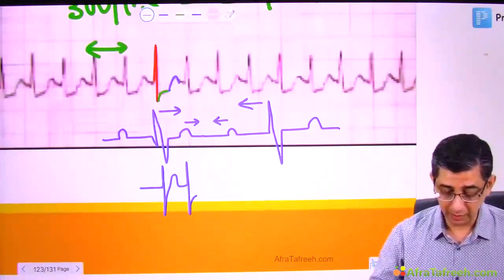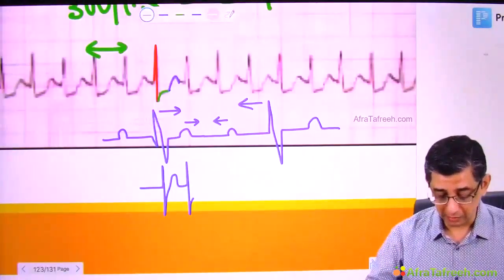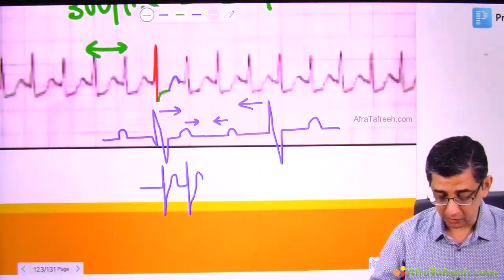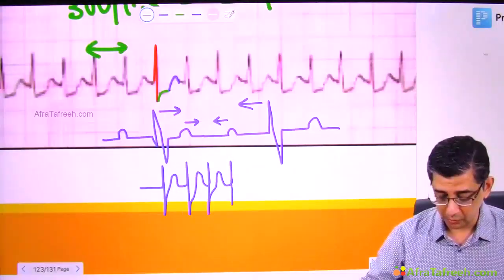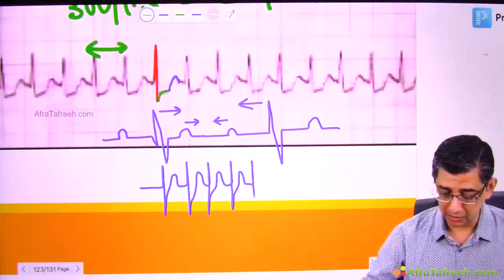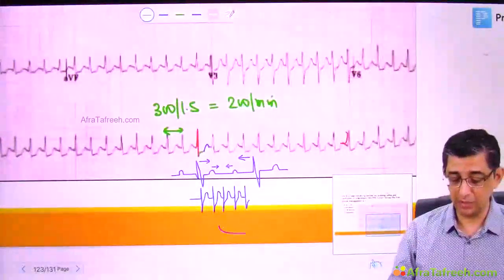In some ECGs, it may not be so prevalent, or I would say so prominent. Why? Because of the heart rate which is increased. So this is the kind of representation that you will always get for paroxysmal supraventricular tachycardia, also called AVNRT, and that's a very characteristic ECG that is regularly being given in the exams.